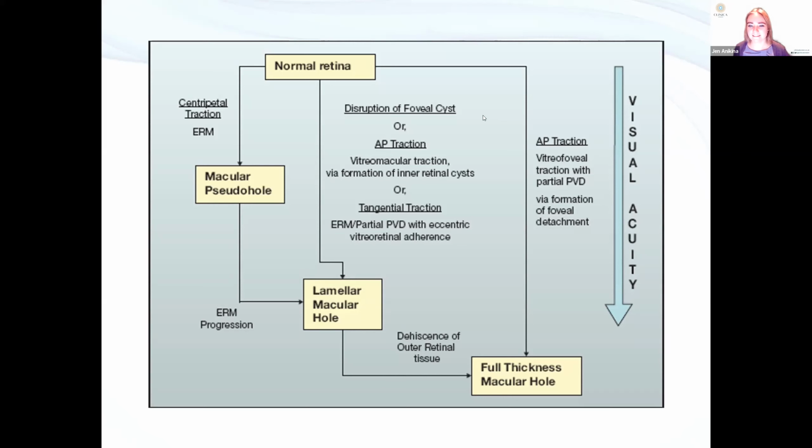I should have made the orange and green a bit more obvious. That's a cardinal mistake, isn't it? You're supposed to make your presentations all blue and orange. That shall be corrected. But cunningly, the flags are orientated differently. The red ones are the straight up ones, and the orange ones are fat and slanted, and the green ones are skinny and slanted. So that might help you.